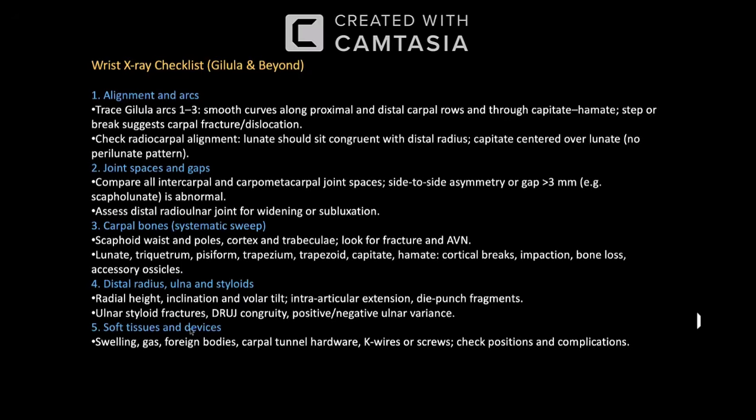Then finally look at the soft tissues, look for swelling, any foreign bodies, or if there is any K-wire being fixed, look at its position and see if there are any fractures involving it, or if there is any loosening of wire or screws and its complications.